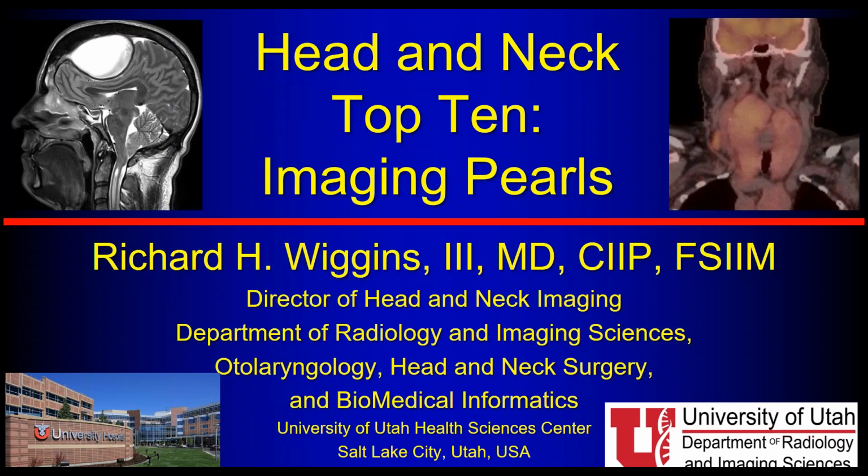Now, we can do the same thing with a puffy throat. If I tell them to puff out their cheeks and hold their breath, take a big deep breath and hold it in, that's going to dilate up all the areas around the larynx. The larynx for us is this complicated cartilaginous framework with the mucosal surfaces draped over it. So if somebody says epiglottis, glossoepiglottic, pharyngoepiglottic folds, vallecula, if they say any of those areas, I know if I do a second pass with a puffy throat, then I'll be able to dilate up those air-filled areas and see them much better. So that's what I do, the puffy throat in those sequences.